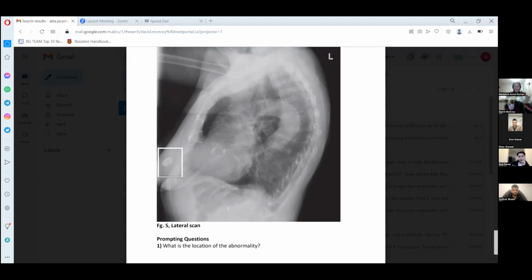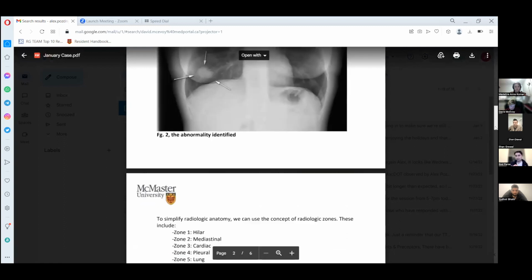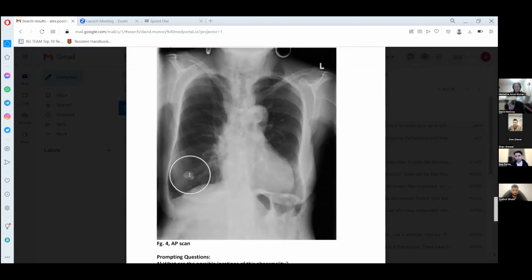I have a question. I noticed on the one we're currently looking at, the nodule was more defined in the AP view. You could tell it had some topology. Yeah, so this one looks pretty vague and white, but the next one looks very defined. You can see some lines on it, if you go down to the frontal view. You can tell it has some wrinkles or whatever. Is that because it's closer to the surface? Can you tell how deep something is by looking at it?